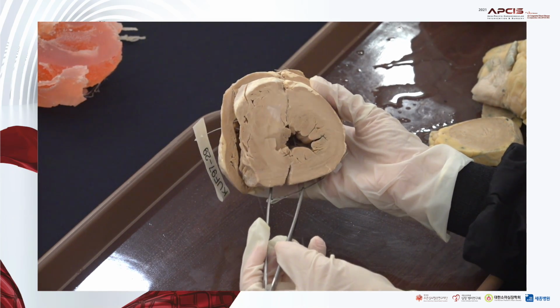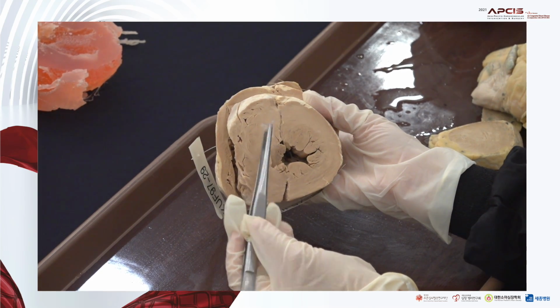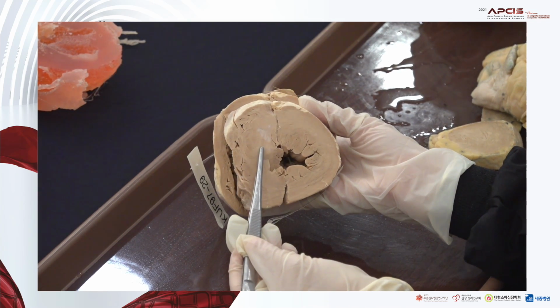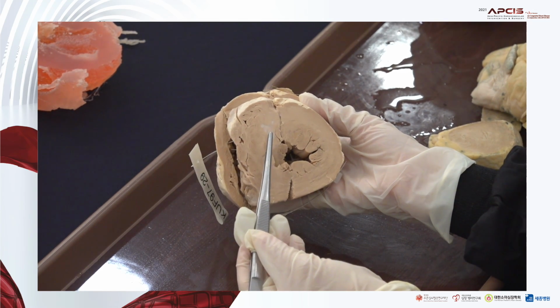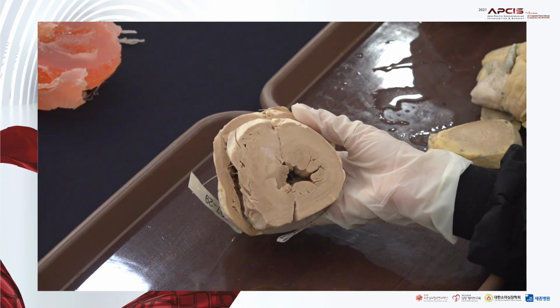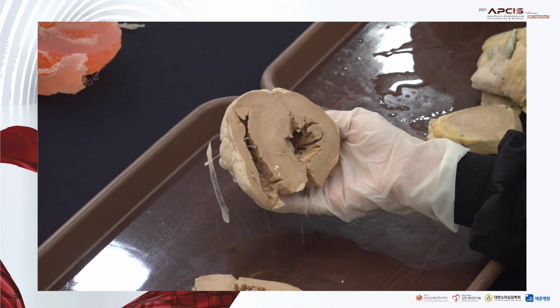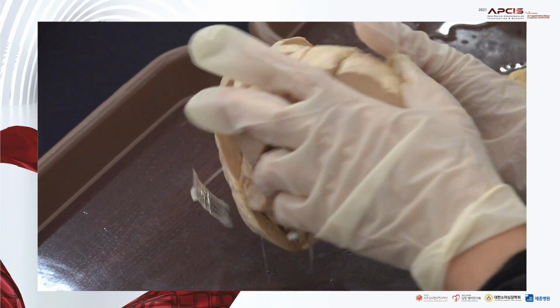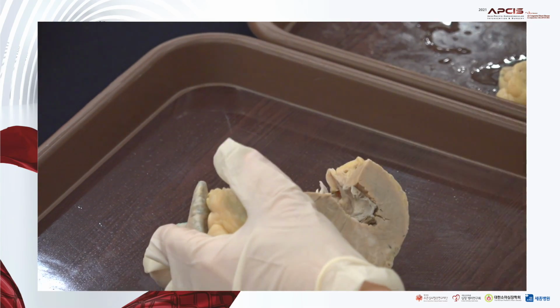You can recognize. And also here, as Dr. Lee already mentioned, there are scar portions, whitish fibrotic areas, replacing myocardial loss. Maybe we can look at another one to see the subaortic portion.